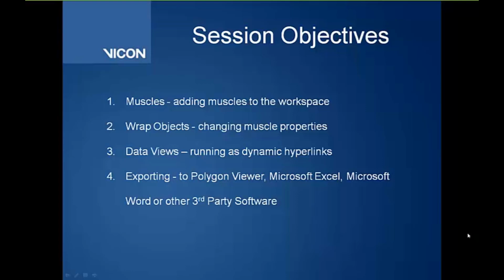And we'll also be talking about exporting, how you can export a Polygon report to either Polygon Viewer, Microsoft Excel, Microsoft Word, or another third-party software like Adobe.